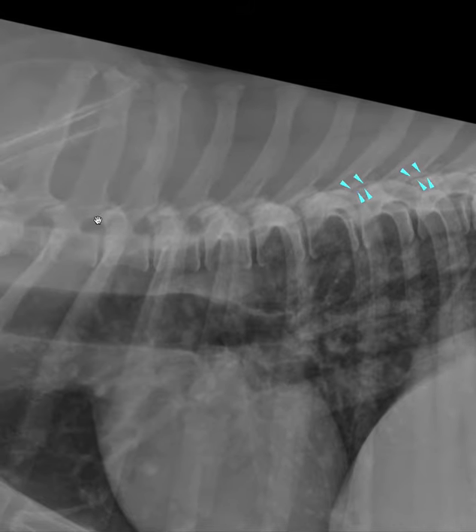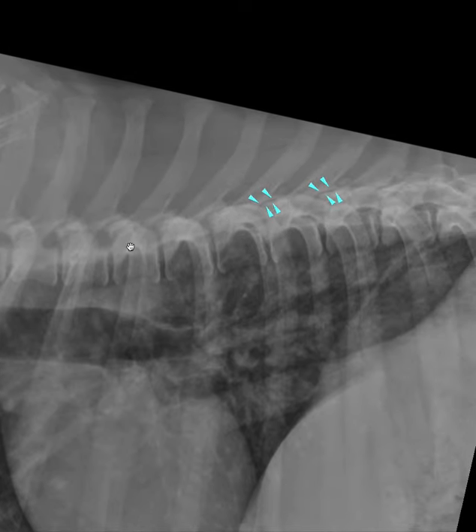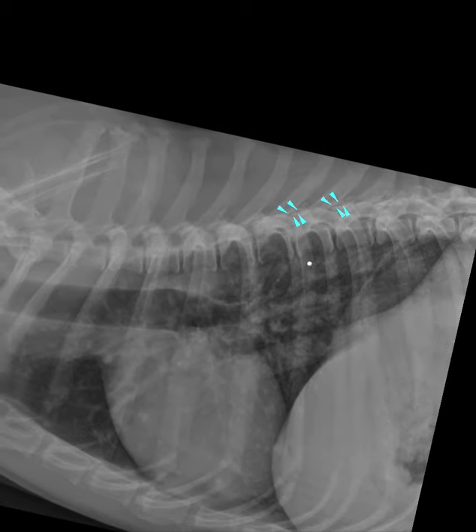So this is just kind of this whole area where I know the spinal cord is going. And as I do that, I can look at the intervertebral foramen. So the size of these foramen, whether or not they have normal opacity, etc. You can see, I'm going to zoom out so we can see a little bit more. Here in the cranial T-spine, I see the foramen really well, these lucent areas. As we go back here, we have a little bit of obliquity, the rib heads are in the way, and so I'm having a little bit of a technical difficulty seeing the foramen.